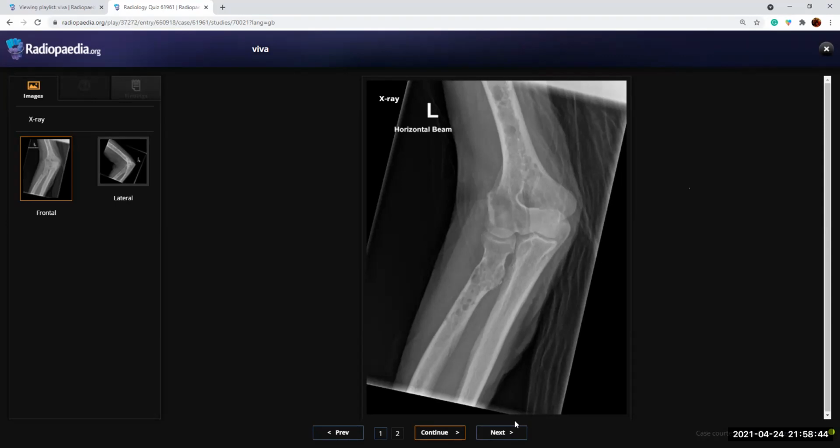It could be from the primary, usually the renal cells, these are not expansile. I will take a little step back because these are lesions with beveled edges. So it could be eosinophilic granulomas. The second possibility could be the metastasis.